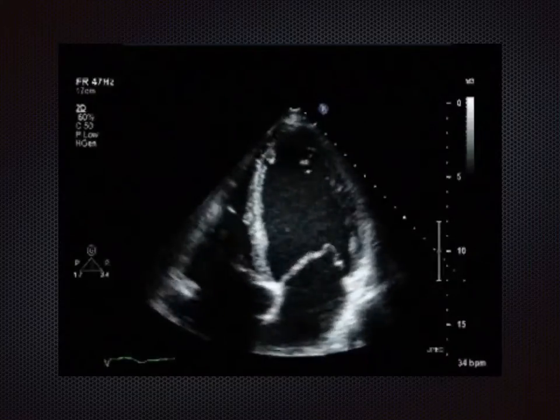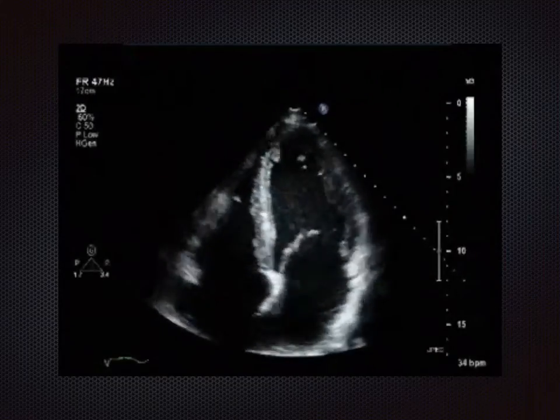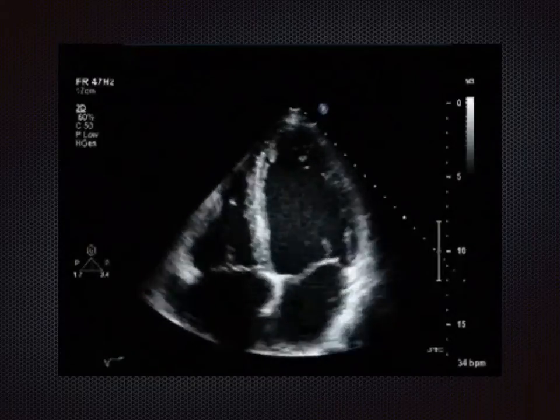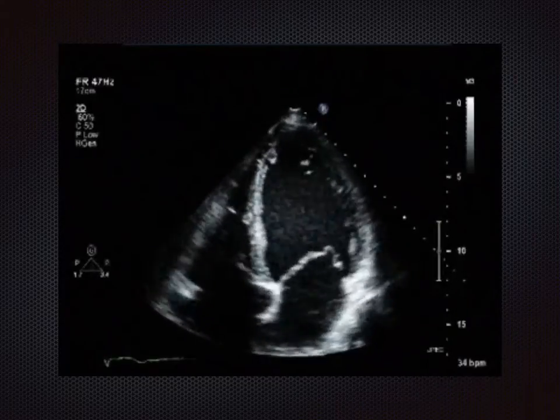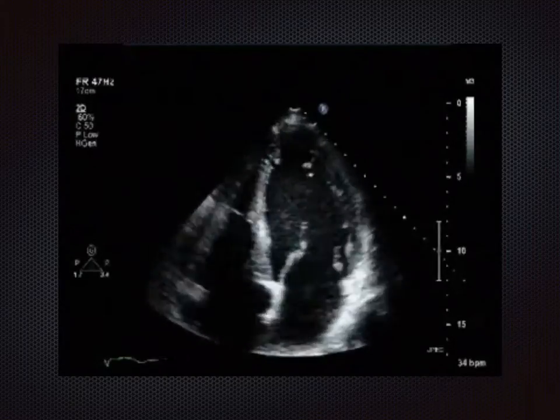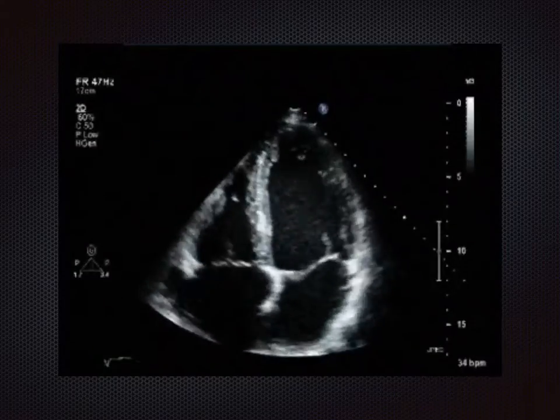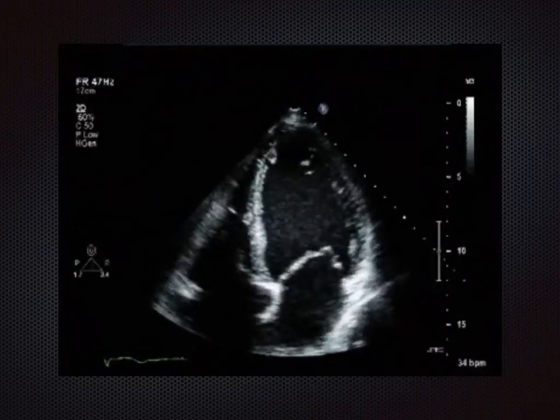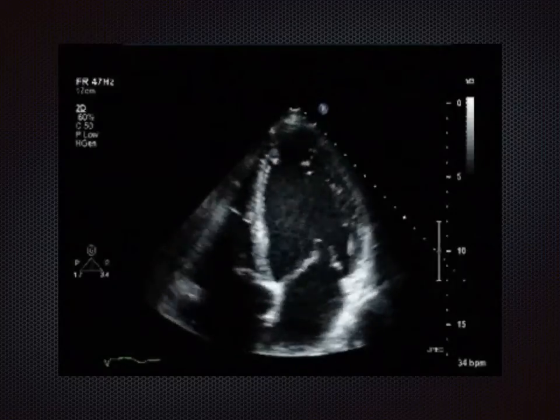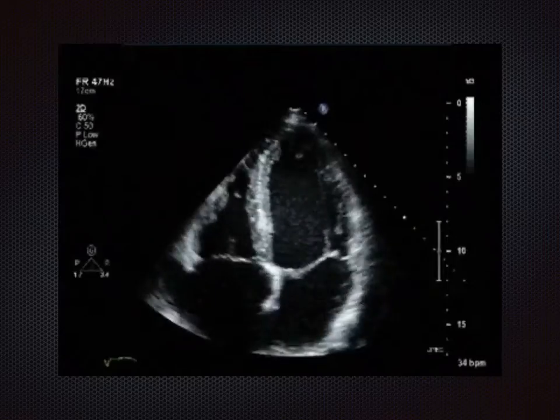It's much wider on the left ventricle than it is on the right side, and so it should be the 2/3 rule. So remember, the right side shouldn't be more than 2/3 the width of the left side. Now, there may be some chronic conditions as well that can cause this, not just things like acute pulmonary embolus, but your role is really just to spot that there is a problem, not necessarily conclude it's due to a particular condition. So remember, the width and the ratio is important.